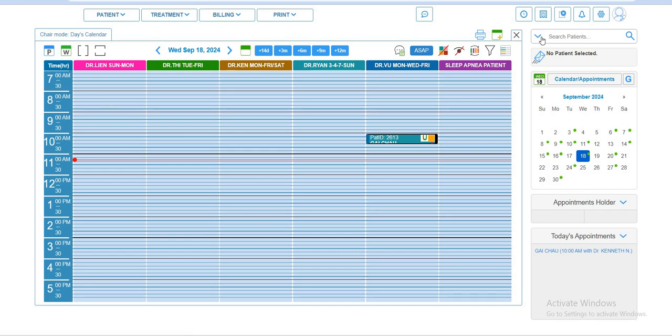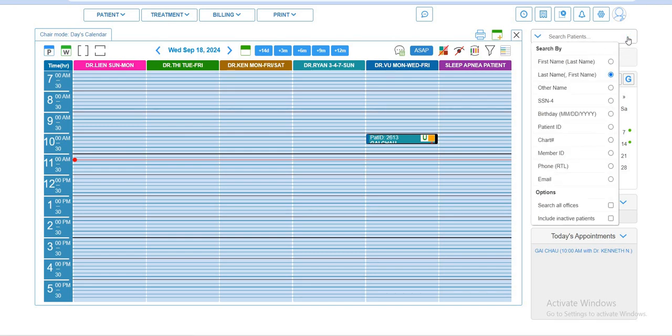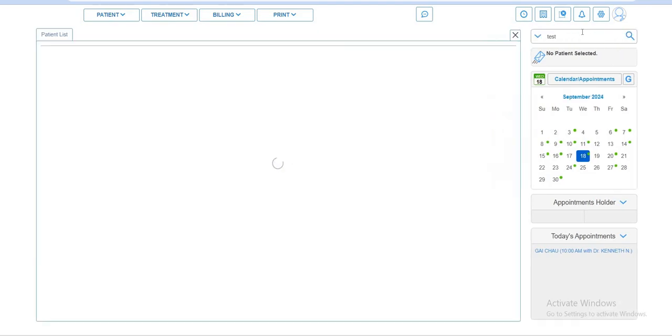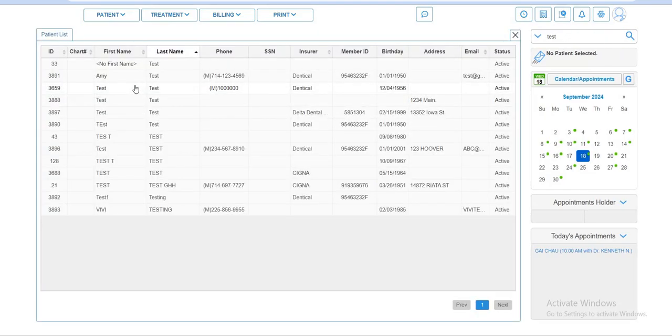Clinical part, the first step. Let me select any test patient. Let me see if you have a test profile. Okay, test. So let me select here Amy test.